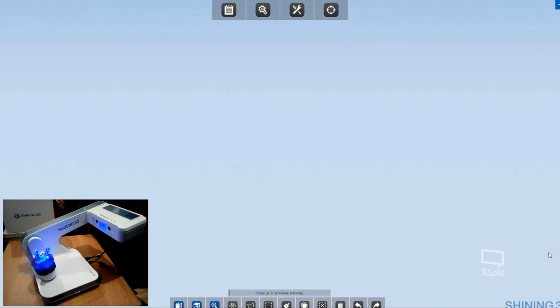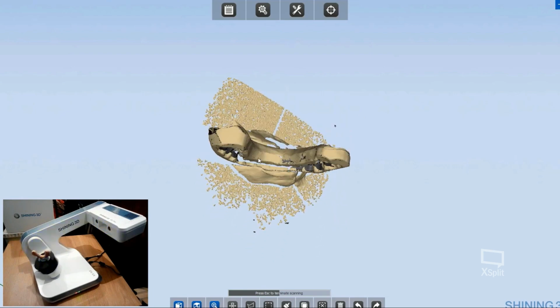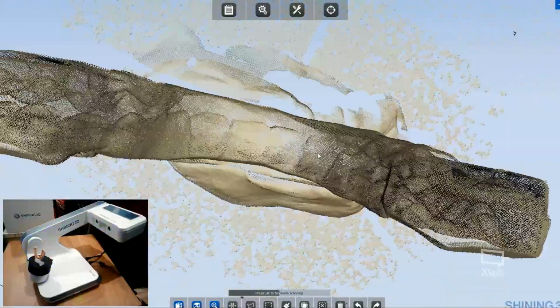The plate moves, and the optical group starts acquiring the surface of my object, as you can see on the monitor. The first result of an acquisition is a point cloud, as you can see here.